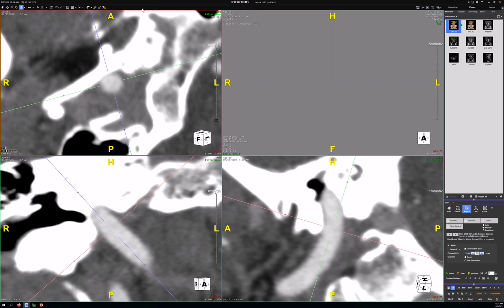So if you hover up here and hold down the shift key, you'll get a little red circle. Now roll it in so that the diameter of the circle is equivalent to the short axis of the oval, not the long axis. There. One more roll back. Now that you've done that, move it slightly out so that the edge of this circle is touching the edge of the long axis.